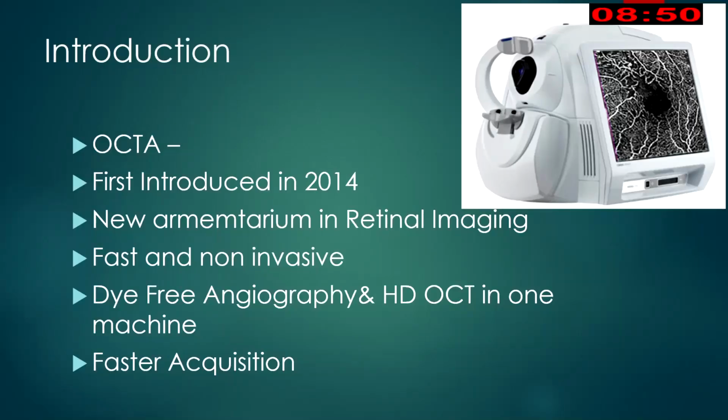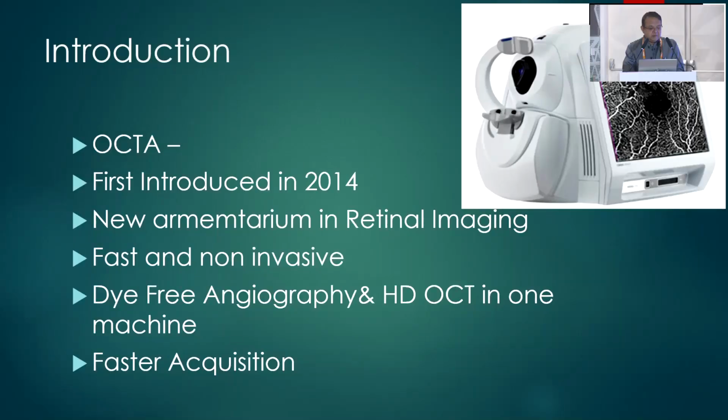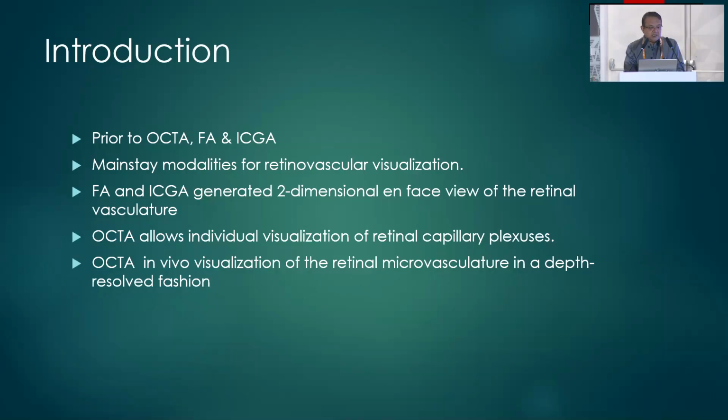Thank you, Ritesh. We'll start first by learning what OCT angiography is and how to interpret it. OCTA was first introduced in 2014. It is a new armamentarium in retinal imaging, fast and non-invasive, dye-free angiography with high definition OCT in one machine. Prior to OCTA, FA and ICG were the mainstay modalities to detect abnormalities in retinovascular visualization. Fluorescein angiography and ICGA generated a two-dimensional en-face view of the retinal vasculature.